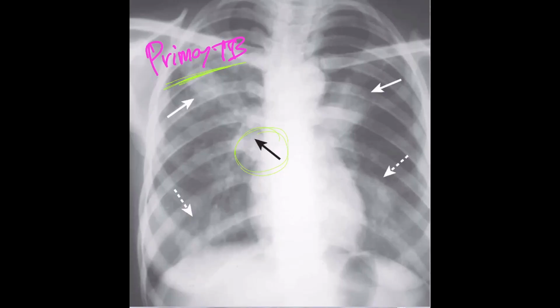And you have here what looks like a consolidation with air bronchogram. That's in the left upper lobe. And you have another one here, which is another consolidation with air bronchogram of infection. So infection in the apex of the lung, apical pneumonia, is a common finding in TB, which will be bacterial superadded infection on the tuberculosis. And we have some lower consolidation here, which might represent, again, bacterial superadded infection, but upper lobar infection in TB is more common than the lower lobes.